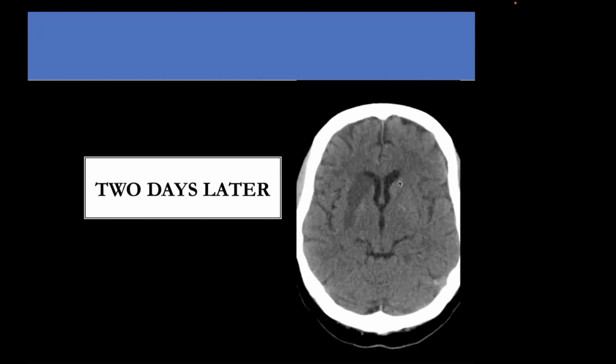Remember that the inferior caudate head is not supplied in most patients by the middle cerebral artery. It's supplied by a branch off of the anterior cerebral artery, the recurrent artery of Hübner. So when the inferior caudate is involved, as well as the lentiform nucleus, think about ICA occlusion rather than just an MCA occlusion.